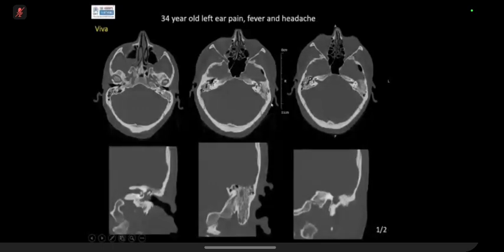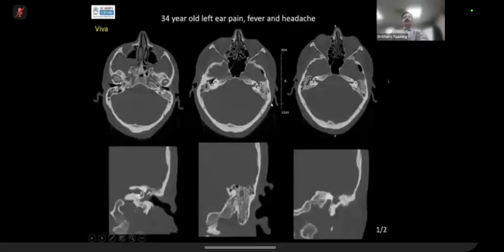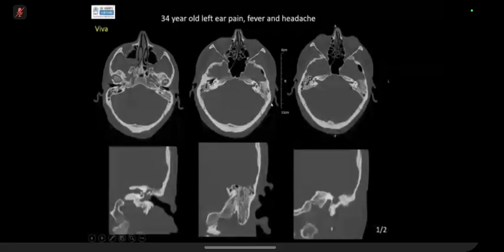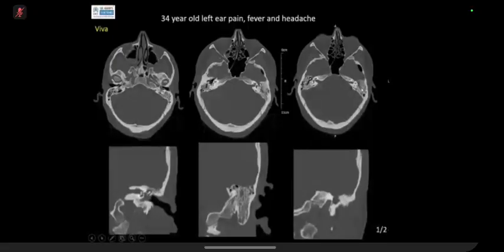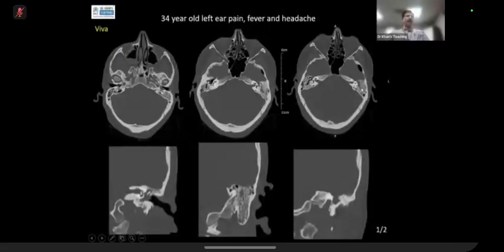Right, so there appears to be a locule of gas within the temporal... within the middle ear cavity, right? Apart from the middle ear? I'm using the wrong word. Middle cranial fossa, right? Okay. Yes. Now, have you seen any bony abnormality?